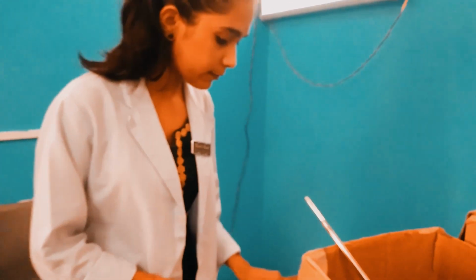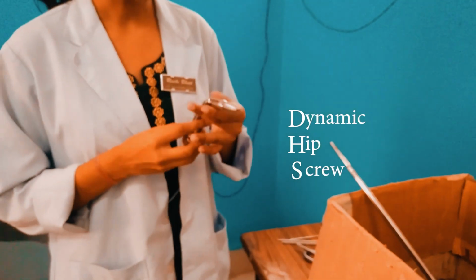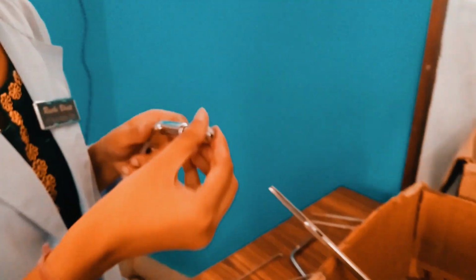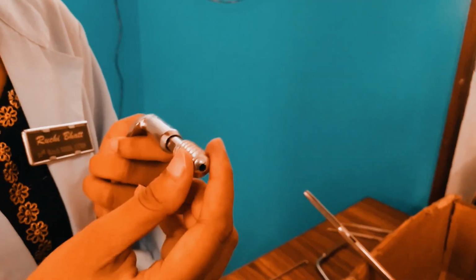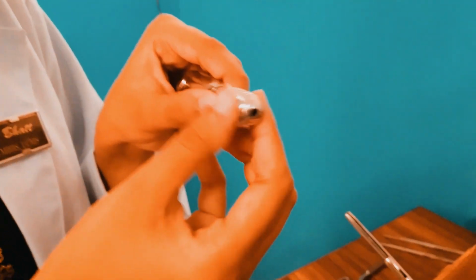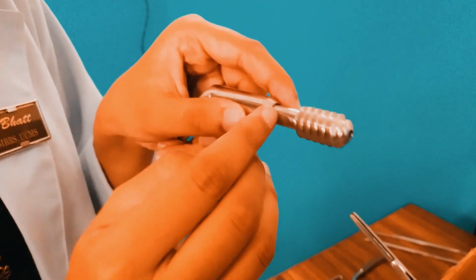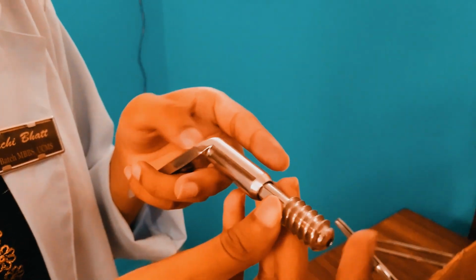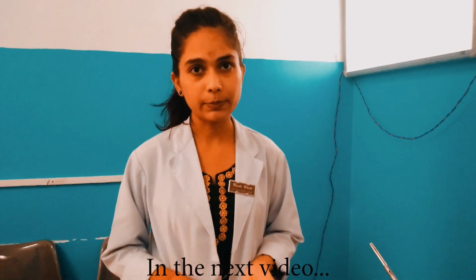Along with this, we have the screw in the DHS system, the dynamic hip screw system. This system has a plate and a screw. This is also a kind of screw. The name of this screw is the sliding DHS screw. This is cannulated; we can see the cannula inside, and it consists of a thread. It has a shaft, and this shaft is always for the lag effect. Now let's talk about the implants. We have nails and plates mainly here.